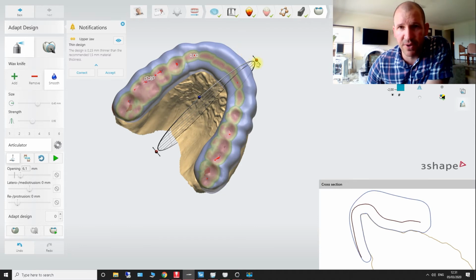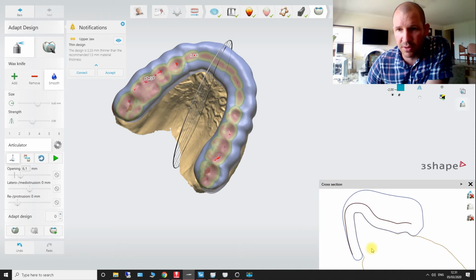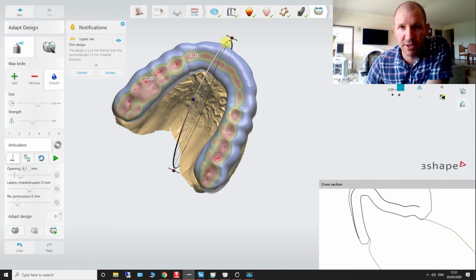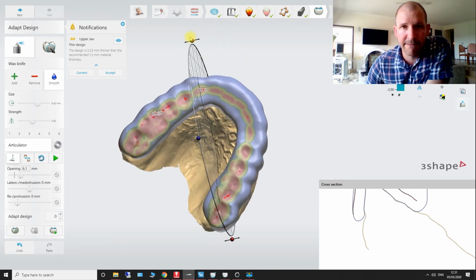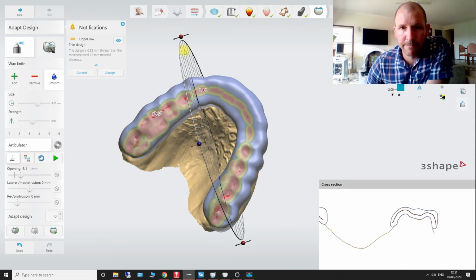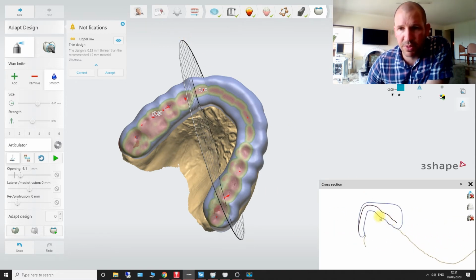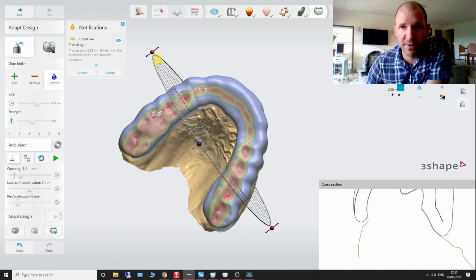That's going to be pretty tight in the front, so you might want to trim it a little bit, you know. Once again, just engaged. Once again, we've just engaged in that undercut. And now we're starting to come. Oh, not that one, so we want to keep on going. So you can see that's engaged just in this little part. So this should clip in, I imagine, quite firmly.